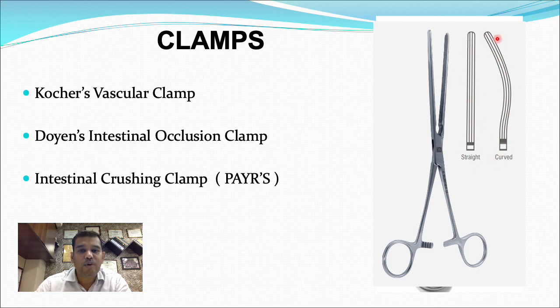So this is very important. Mind, it will occlude the lumen; it is not going to destroy the wall. So normally you apply it over the bowel segment that is to be anastomosed, because it is not going to hamper the vascularity of the tissue per se. So this is used for occluding the lumen, so that fecal contamination in the field when you are doing a resection is not there. You minimize that contamination.